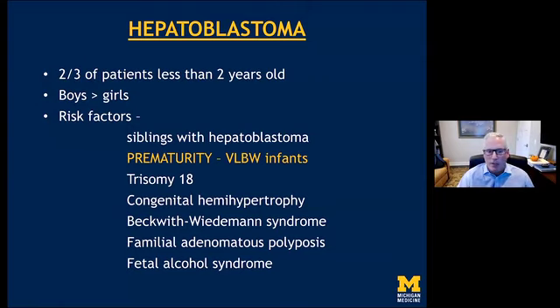Hepatoblastoma, the other lesion that you would be thinking about, is typically not as vascular as that. So that can be helpful, especially if you have one large giant hemangioma. The other thing that will help will also be clinical scenario. So are there risk factors? What is the alpha fetoprotein level?